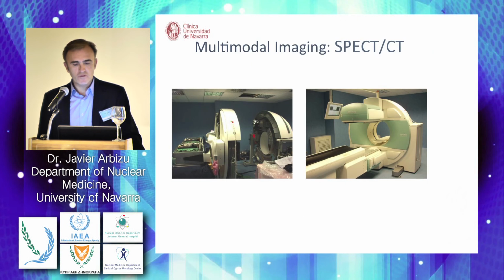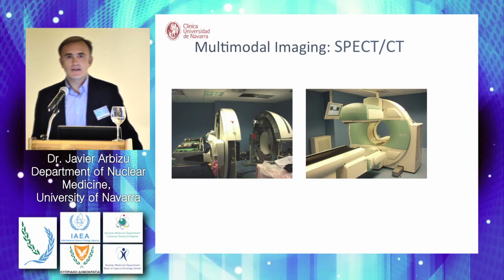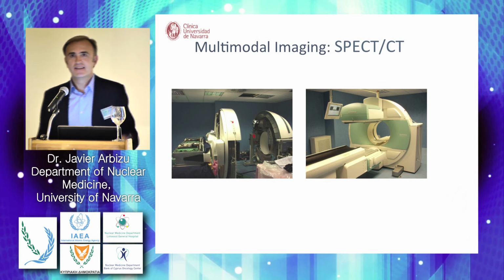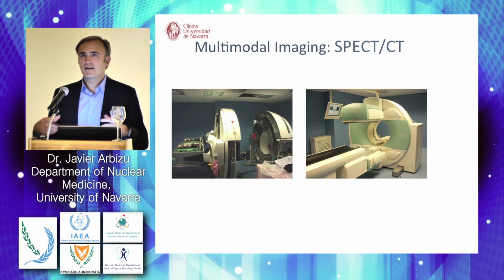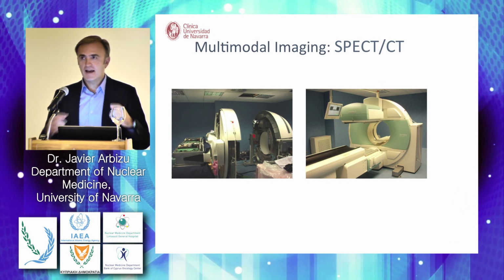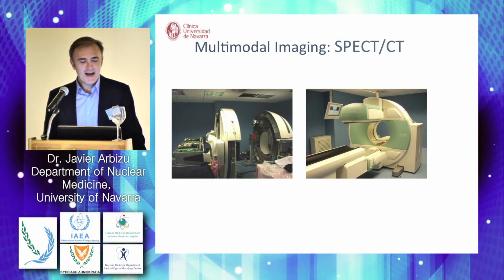What does it mean for those who are not familiar with these devices? Well, it's like a sandwich. This is the day we started, when the technicians were just installing all the devices. I was taking pictures of this.